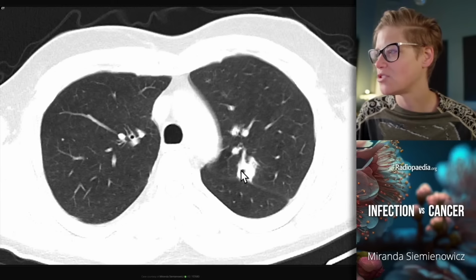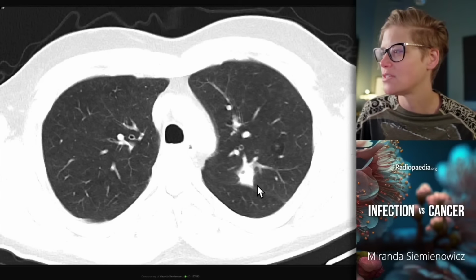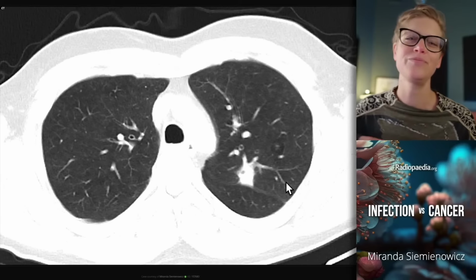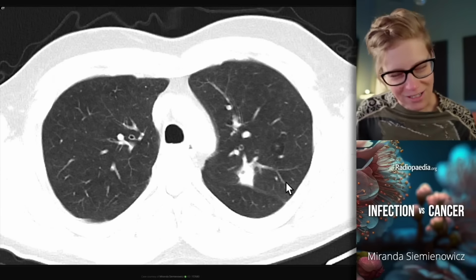We've got a little central locule of gas, so there's some cavitation within the lesion, but there is a clear polygonal morphology to this. We've got a beautiful 120-degree angle here. We've got this hexagonal structure, a abutting pleura, a straight edge here. And you would never assess a fracture in just one projection. Let's look at the coronal.